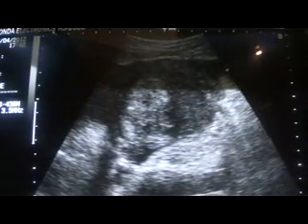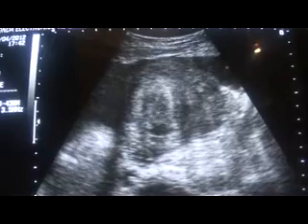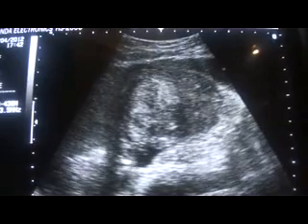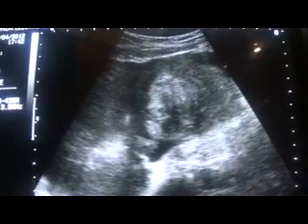And another thing to note is that this is the endometrial canal, and the endometrial canal is taking a sharp turn anterior to the fibroid. Same is the case here. This is the endometrial canal and is elevated above this fibroid. Small fluid is seen in the pelvic cavity because of cirrhosis.